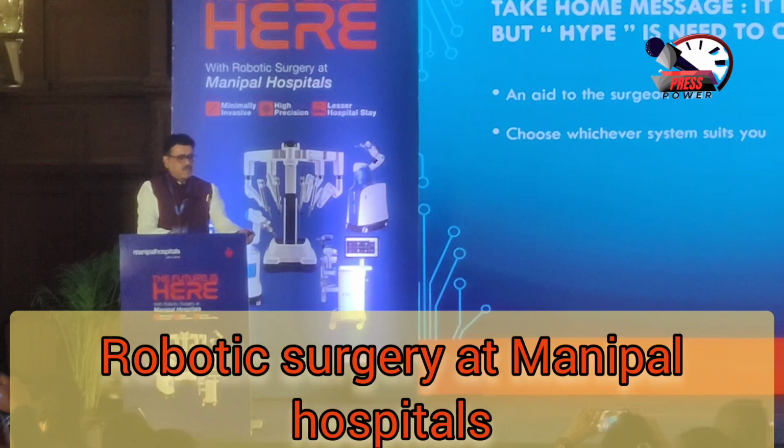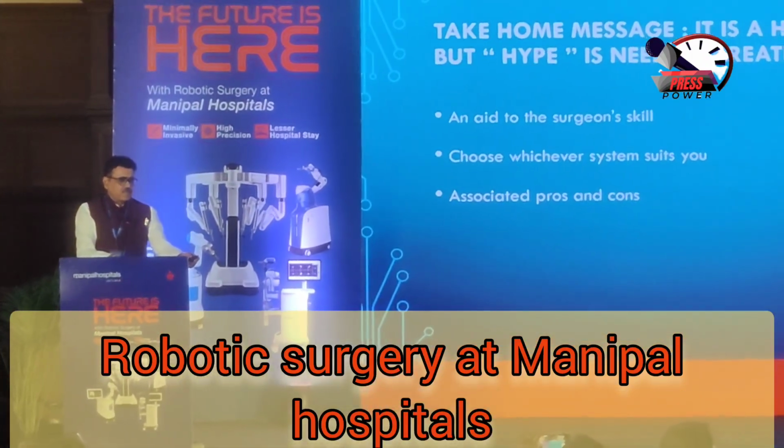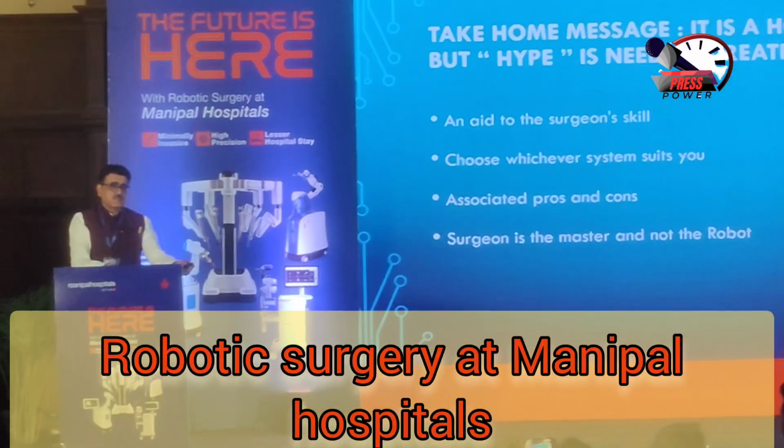So, these are the things. It's an aid to surgeon skill. Choose whichever system suits you. Associated pros and cons. Surgeon is a master and not the robot.